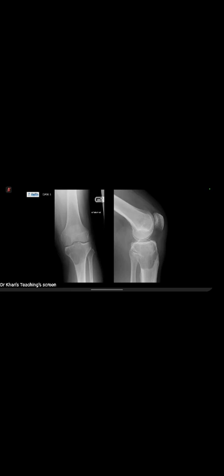Okay, good. Can you talk to me a little bit? You said narrow zone of transition. Can you talk to me a little bit about the lateral margin of the lesion? The lateral margin of the lesion is not sclerotic. There is no sclerosis surrounding it. However, I see it partially sharp or partially irregular. It's defined partially. So this is confusing to me as a narrow zone of transition here in the lower border of the lesion.